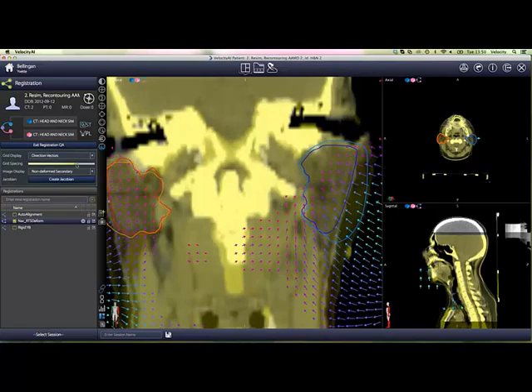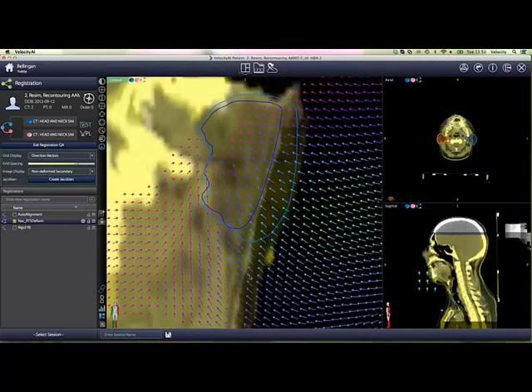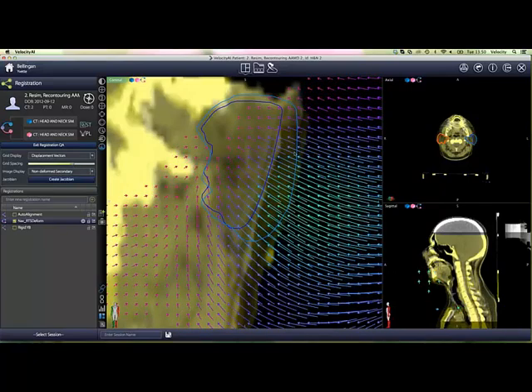But prior to the webinar, and I just didn't have time to do this live, I ran the deformable registration, and what I did is I created a report. So what you do is you take the deformable registration and you look at specific structures, like the parotid in this case, and I look at the amount of warping. The warping is the amount of displacement that takes place.